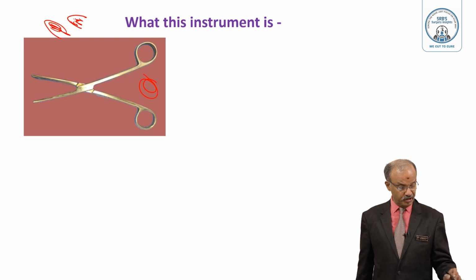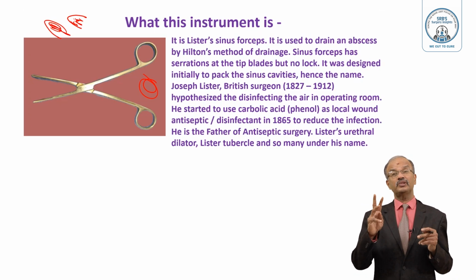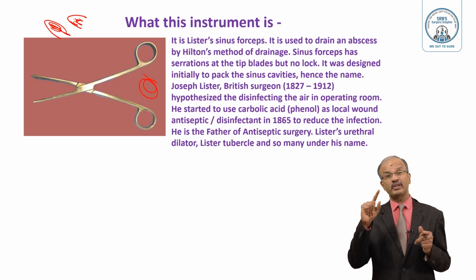Without a lock, this instrument is nothing other than Lister's sinus forceps. So the sinus forceps has no lock. It is currently used to drain an abscess cavity by Hilton's method of drainage. It's a common MCQ question, or they will ask it in the viva.